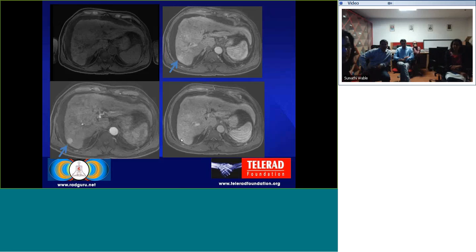Typically, anywhere from 3 to 8 minutes is fine. 3 to 5 minutes is what people use. But again, there's really not washout. So if you were to categorize based on just this, seeing everything, what would you do? You probably would put it in a 4, because it's a well-defined lesion. It's a nodule. You already know that from the pre-contrast. It's enhancing. I mean, that is the most sensitive part, the arterial phase. And it's somewhat washing out, but you would have liked to see a complete washout, which you don't. But it's more than 1 centimeter. So I would put it as a category 4 lesion.